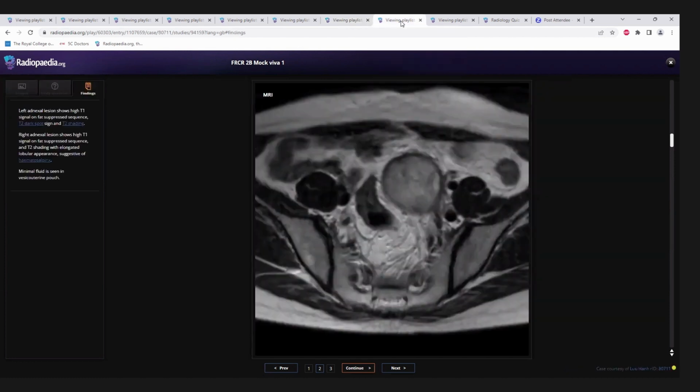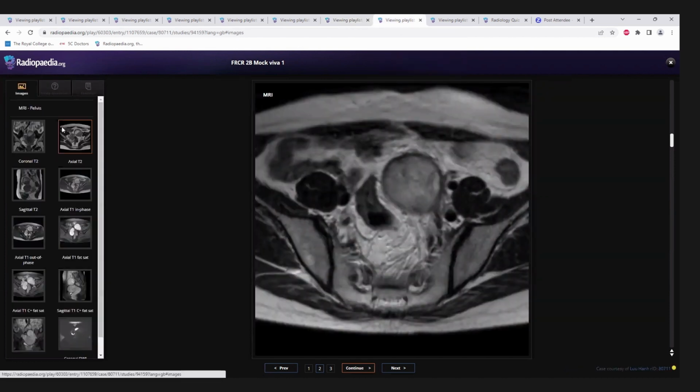Great. Okay. This is the companion case. I would have to give you the... Okay, do you have the remote control? Yes. You will have to give me a detailed description. Okay. Yeah. Take your time. Okay, you mean I have to give a detailed description? Yes, please. The multiple findings.